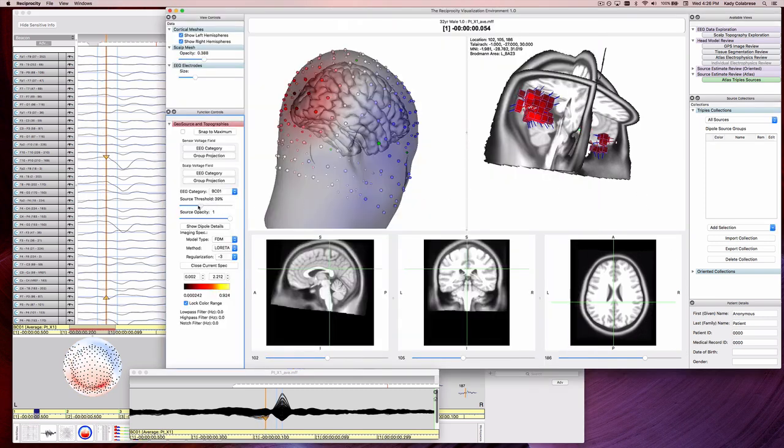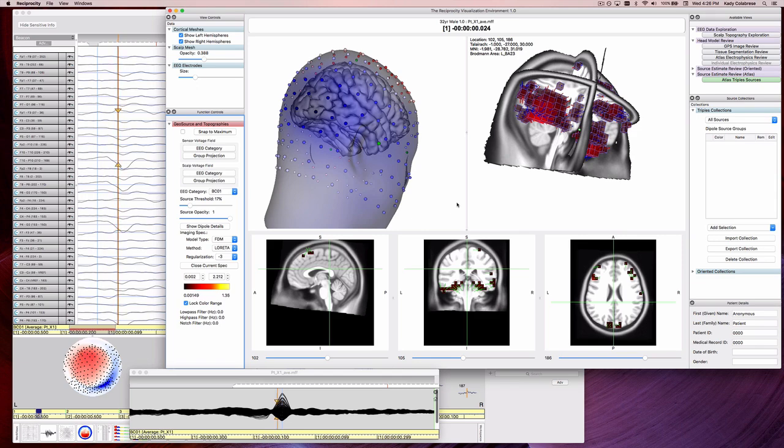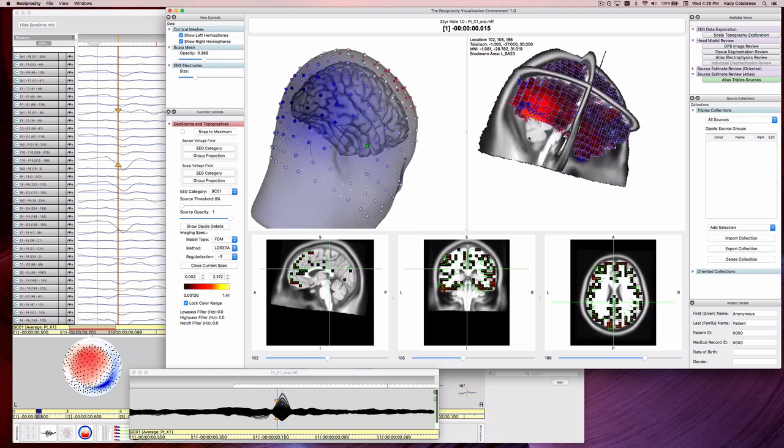How stable is this source over time? Does it correlate with the smoothness of the scalp topography? If it jumps around or the map is not smooth, rule out artifact by looking at the scalp data and reviewing each channel, not just the subset in a montage. Next, evaluate the vectors of the source result. Each voxel has a dipole with a vector that has one end pointing to the negative field, or blue, and one end pointing to the positive field, or red.